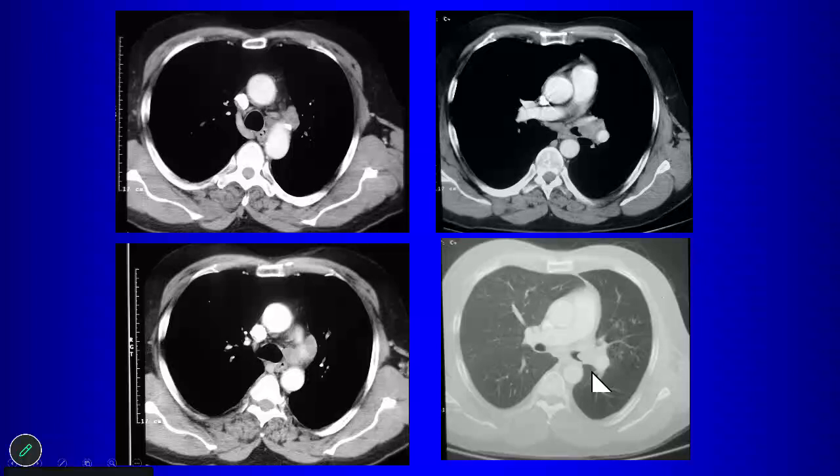Now you would say, cancer. What kind of cancer? Oh, SCC. Squamous cell cancer, right? It's an endobronchial lesion. That's squamous cell cancer. The referring physician comes to you and says, what about these nodules? Are these metastatic nodules to the lungs? What are you going to say?